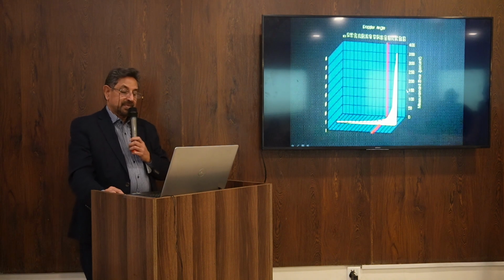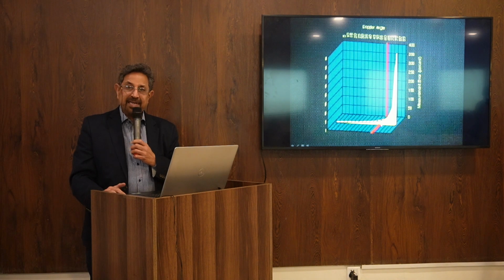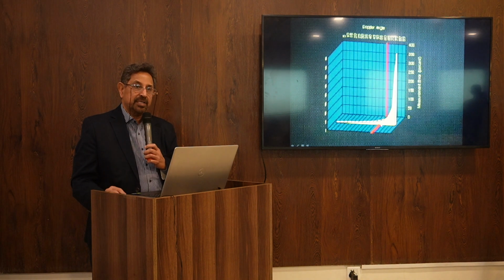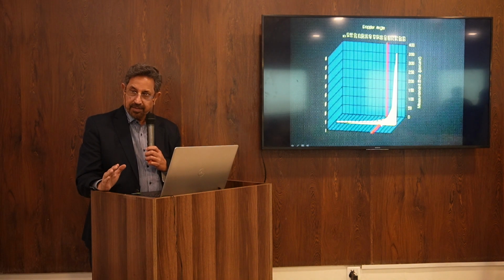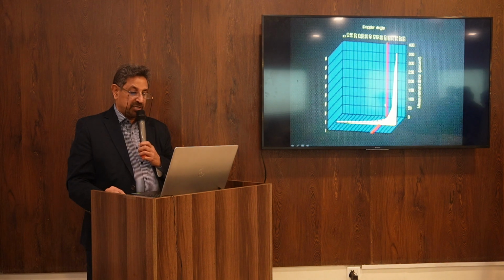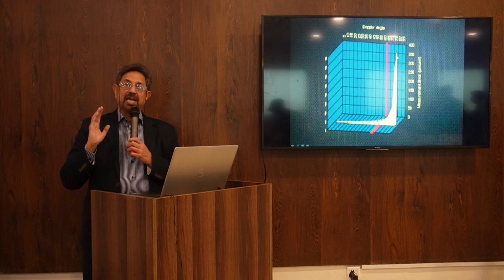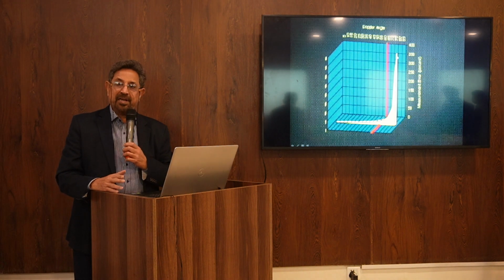And another thing, if our angle is less than 60, we can get a better picture because the error is minimum when it's less than 60. When the angle is 62, there is rocketing of error. You should see here, this graph reflects that up to 60 the error is very low. The moment it goes beyond 60, there is rocketing of error. So if you are scanning at a 70-degree angle, you get very high error.